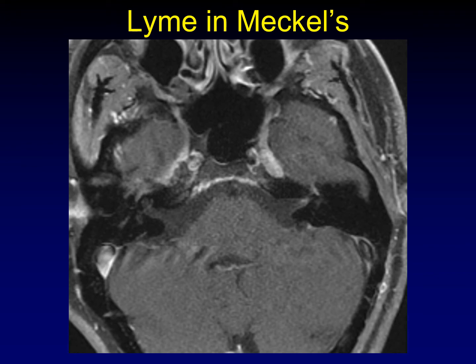So these enhancing masses and inflammatory lesions within Meckel's cave kind of look a lot alike. The clinical history is, of course, going to clue you in to a precise diagnosis.